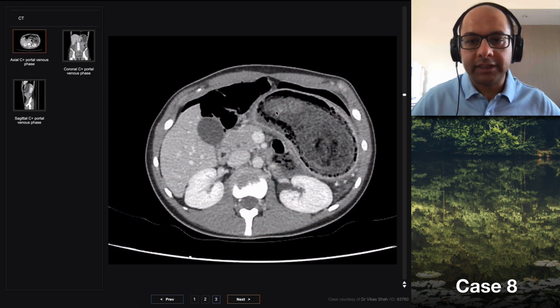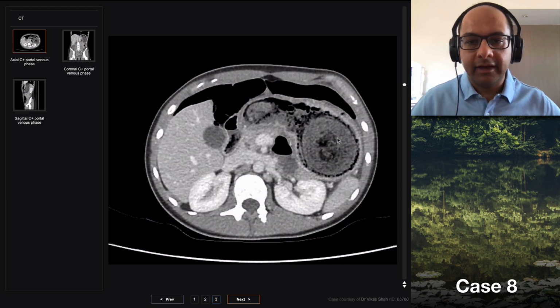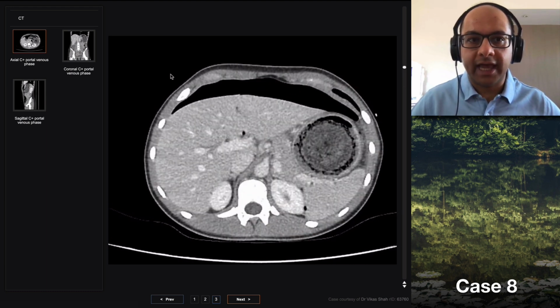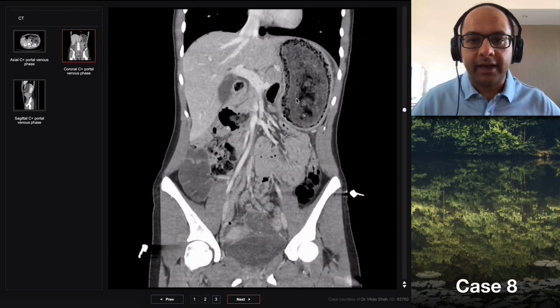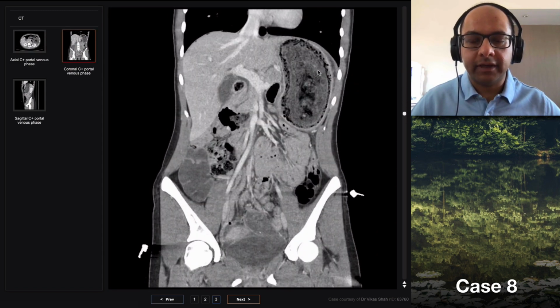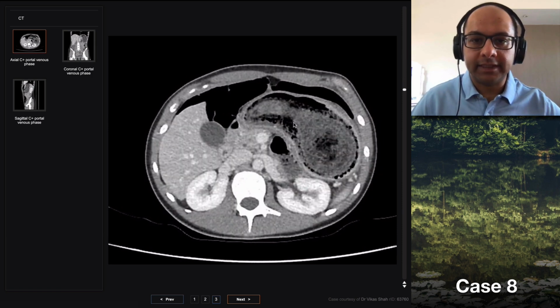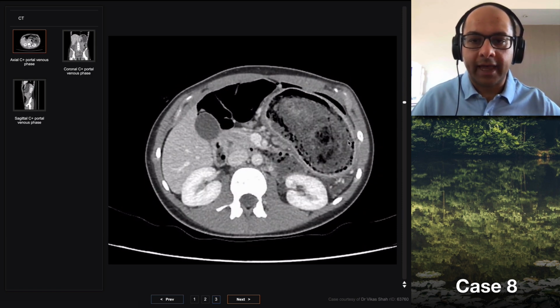So all of this material that you see here, all of this is not food, this is actually hair. So this is just a very large hairball within the stomach. You can see here, okay? It's causing inflammation of the stomach, which has caused the stomach to perforate, and then she's presented with that pneumoperitoneum that you saw on the chest x-ray and on this abdominal CT with a very large volume of air.